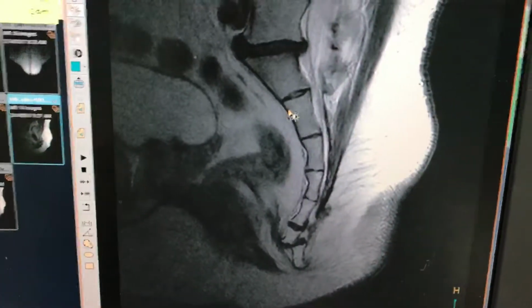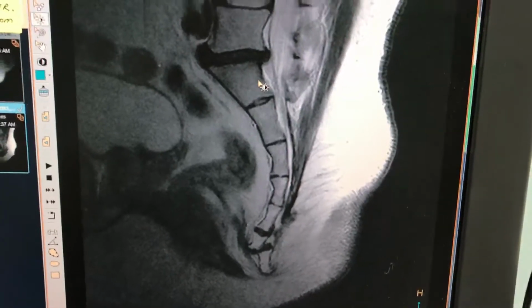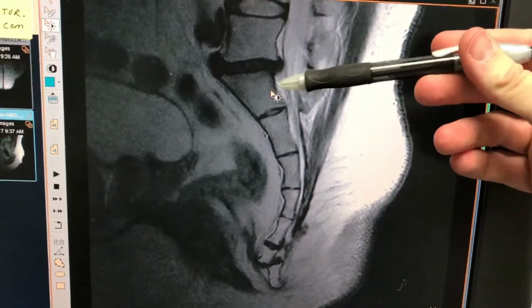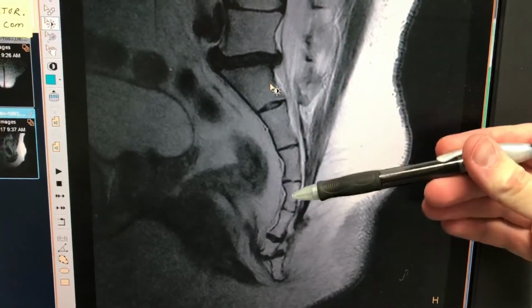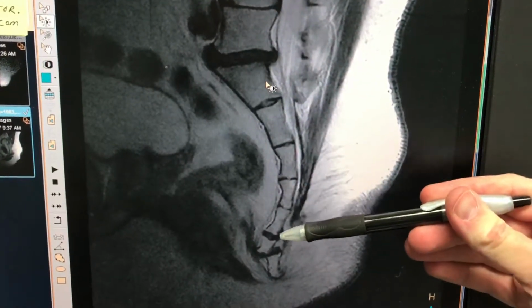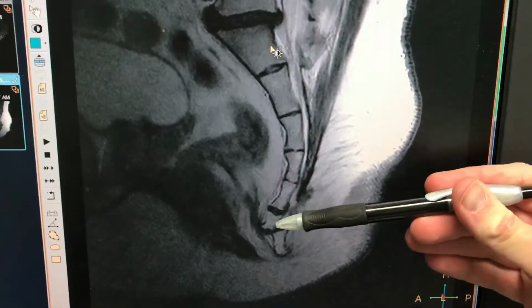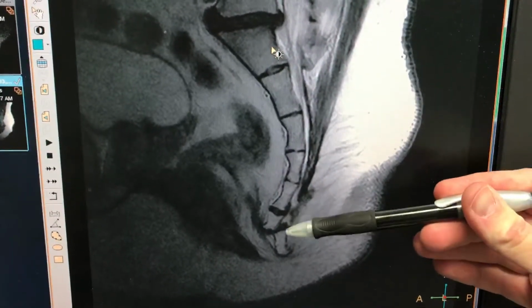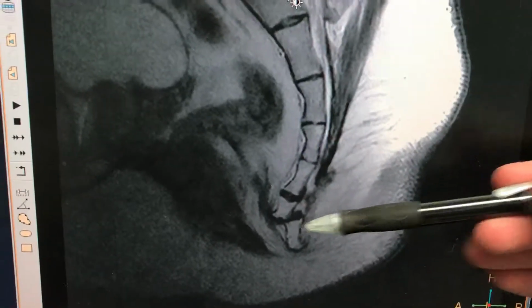The next thing I do is typically count the sacral segments, and usually there are 5 sacral segments. So looking here at sacral bone number 1, 2, 3, 4, and 5. And then that makes this dark line, the joint space between the sacrum and coccyx, which makes this bone number 1 of the coccyx. And then here is the rest of the coccyx. In this case, actually, bones 1 and 2 are together.